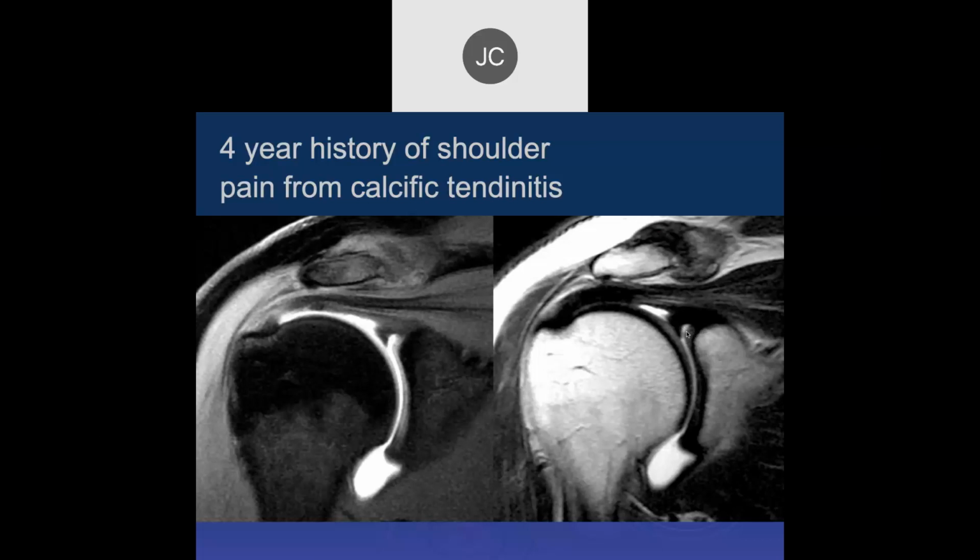What they found was the most reliable differentiation on MR between a superior recess and a superior labral tear was if you saw increased signal intensity going definitively out into the labrum itself. That highly correlated with the tear and not just a normal recess. So that's what you look for in superior labral tears.